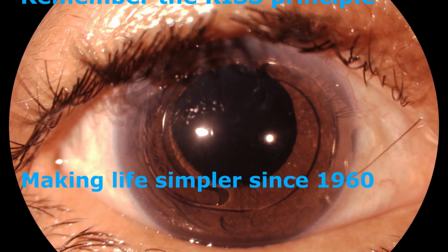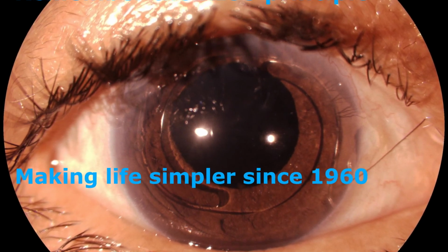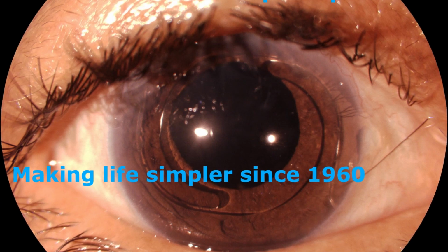So this is my presentation and take on implantation and choice of IOL when there is no capsular support.